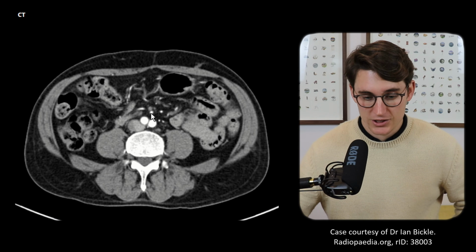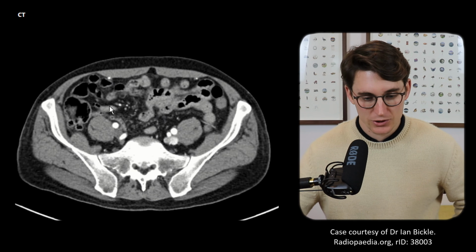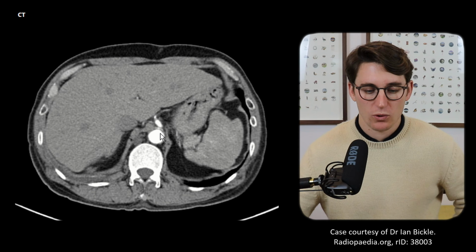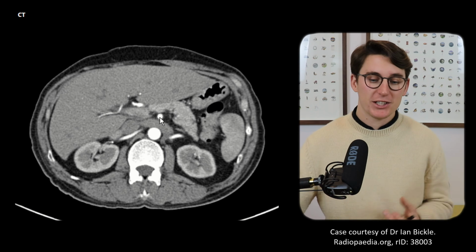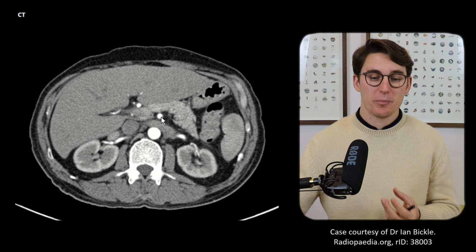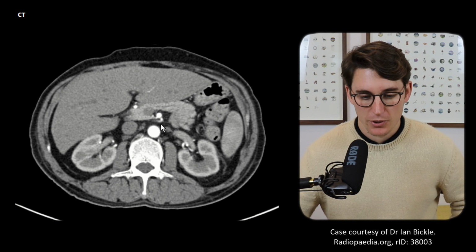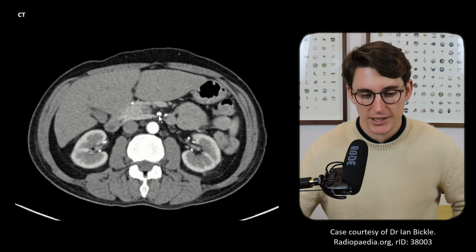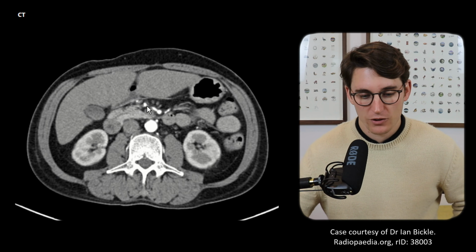And if we follow this artery all the way down, we can see our ileocolic artery going all the way to the cecum. Let's head our way back up right to where the SMA comes off of the abdominal aorta. And we know that on the patient's right-hand side, there needs to be a middle colic artery supplying the transverse colon. So let's have a look for that. We pass the inferior pancreatoduodenal arteries, and we should look for a slightly bigger branch than usual coming off there to the patient's right.